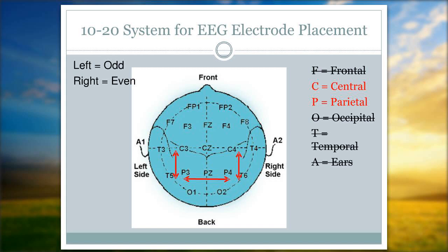When we're talking about aEEG specifically, we actually are only really looking at a limited montage of EEG. We're looking at the area that is under the central and the parietal. So although all these other areas obviously are there, we're not monitoring over these areas. When we want to monitor over specific areas or a more global look, we want to go ahead and get our full montage EEG, where we then place electrodes at all of these locations, and then we can compare them to each other.